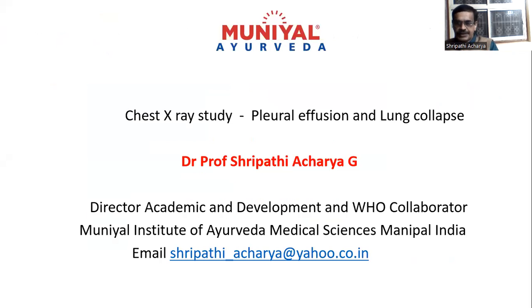So today's topic is chest X-ray view, pleural effusion and lung collapse. The study of pleural effusion and lung collapse. Pleural effusion means there will be accumulation of excessive fluid in the pleural cavity. Lung collapse is also known as atelectasis, where one lobe or the entire lung is collapsed due to air leak.